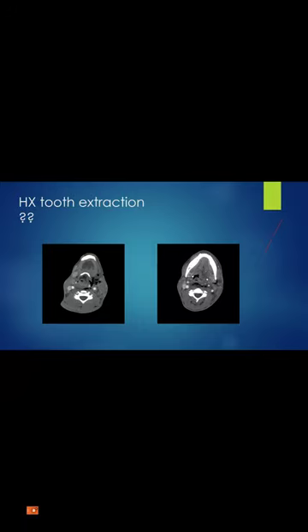This could be an abscess or could be surgical emphysema from the recent procedure, plus the inflammatory changes, plus this low density in the sublingual region. Post-operative, there is skin injury in left side. Yes, that's correct.